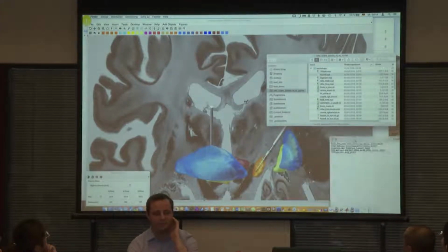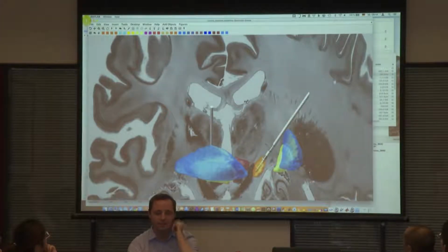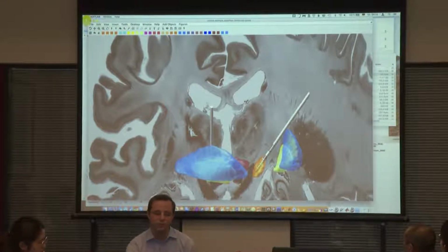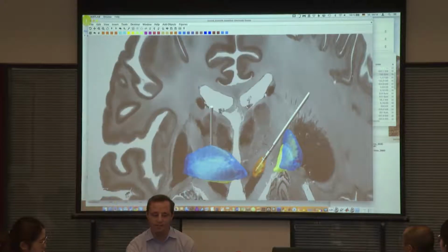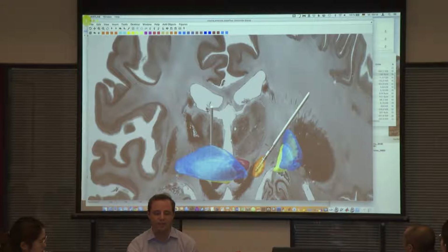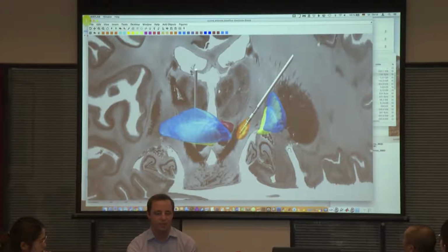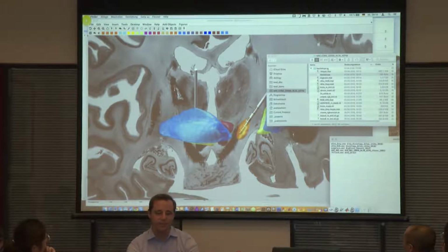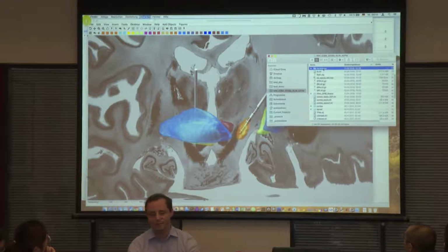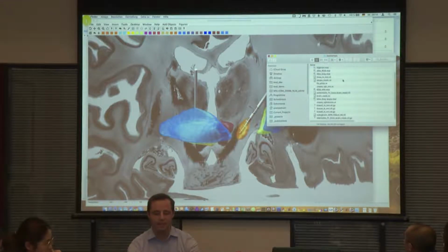And so now, it took a while to load, but this is a high resolution histology image from Jülich, which we can also use to visualize as a backdrop, right? So basically any nifti file you want to show, if you have your own template or so, it should be in MNI space, but these you can put into a folder called backdrops in here, and then they will be shown.